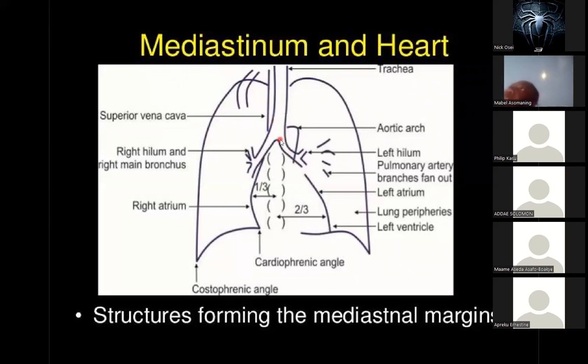And the trachea is divided into the left and the right main bronchus, and they also break further into other bronchi. Okay. And the left border of the heart, the right border of the heart are all here. There are lymph nodes running all the way through. And of course, these are not mediastinum, but let's remember what I said about the costophrenic angle and the cardiophrenic angle.